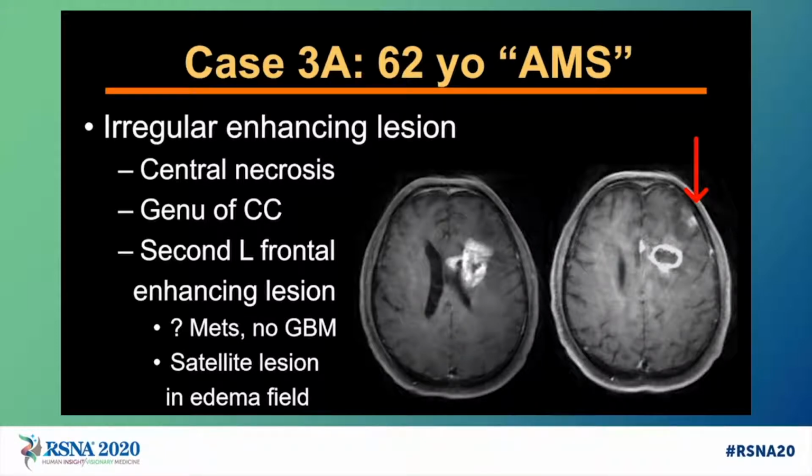Should we be considering metastatic disease in this patient with multiple enhancing lesions? No, we need to realize that high-grade gliomas often have satellite lesions, particularly within the edema field surrounding the main lesion. And in this case, pathology showed that this was a glioblastoma multiforme.